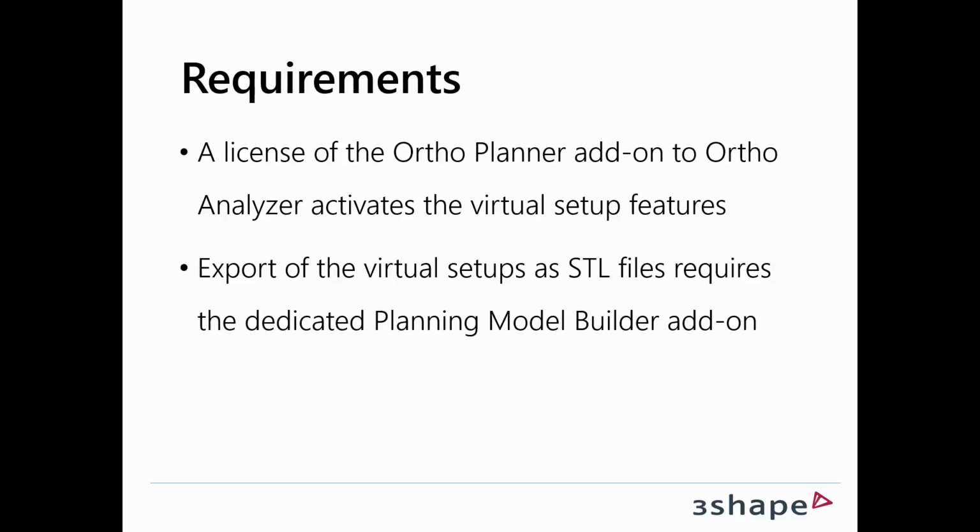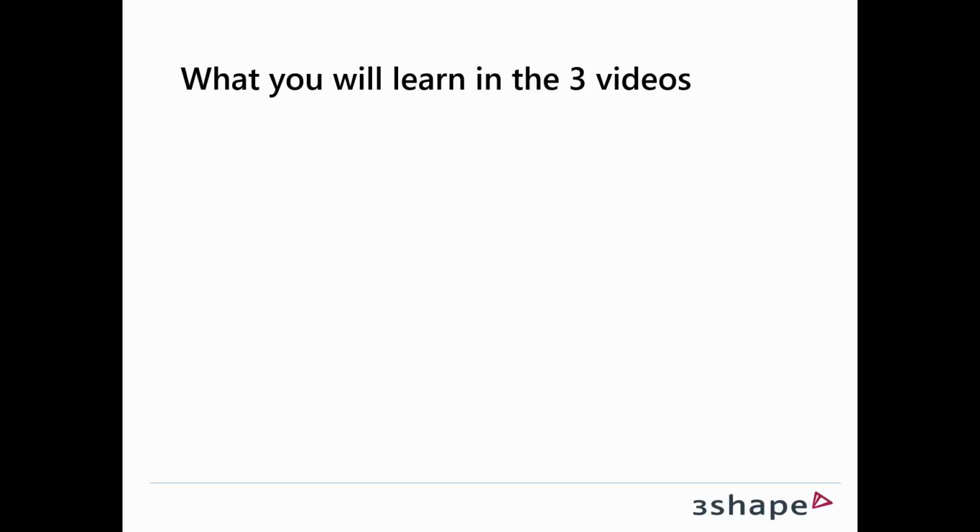So the requirements for using virtual setups: you need a license of the Ortho Planner add-on to the Ortho Analyzer to activate this feature. And also please be aware that if you need to export the virtual setups as STL files, that will require the dedicated Planning Model Builder add-on.